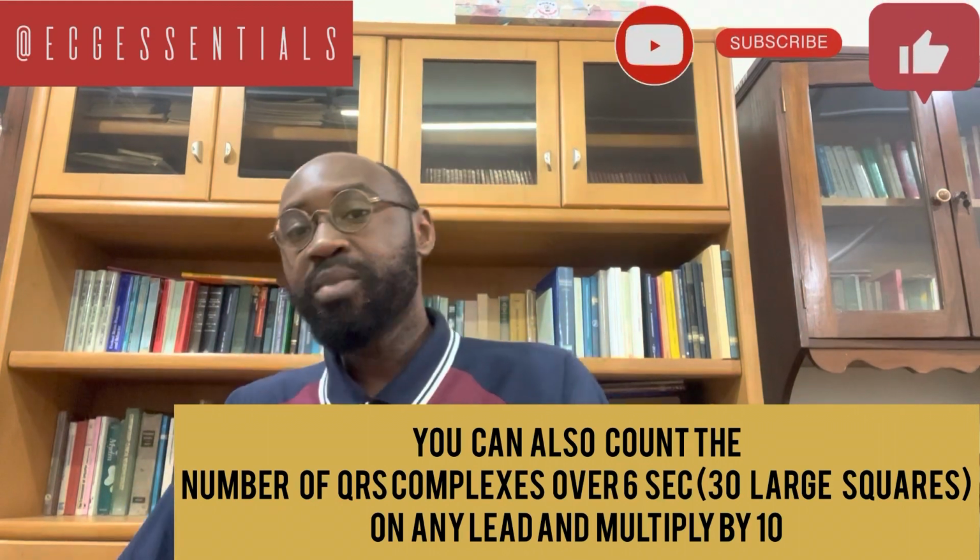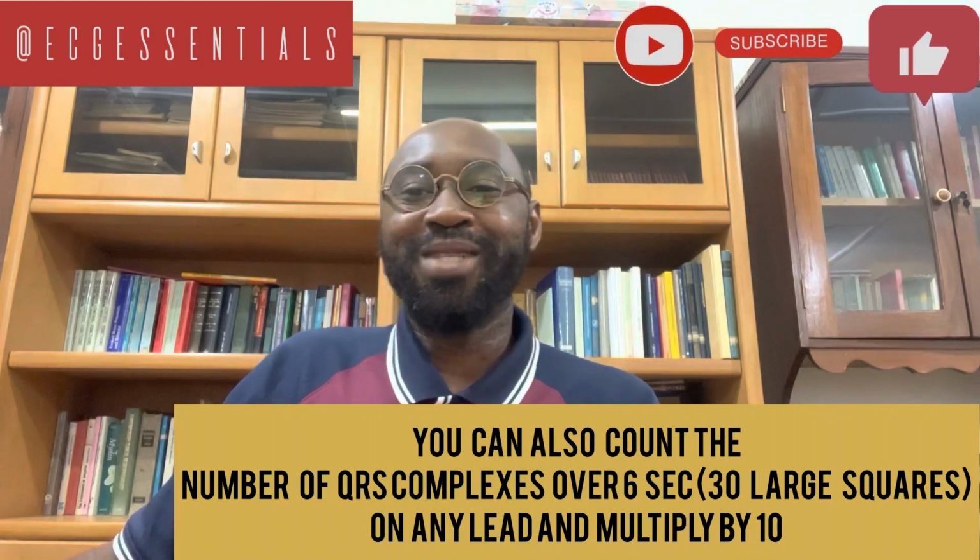All right. Somebody may be asking, the ECG paper usually captures this information in terms of the rate and all other vital information, so why do I have to bother myself? Most often, the information we find on the ECG in terms of the heart rate is correct, and so one may not be very interested in what we have talked about.